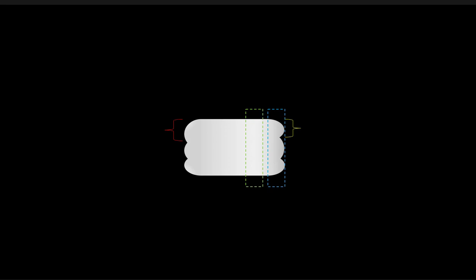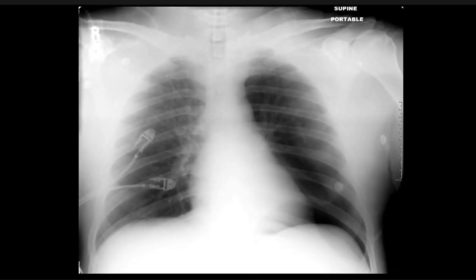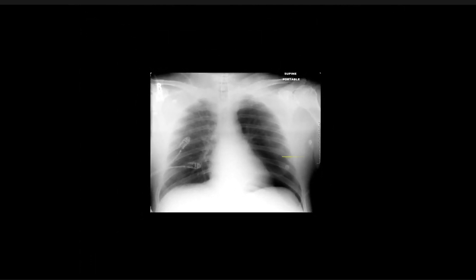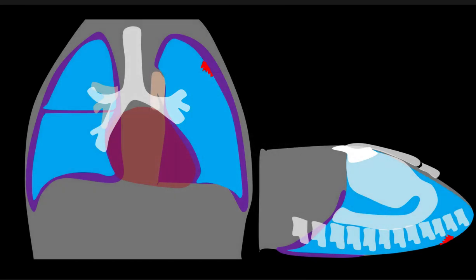And this is useful on a lot of different imaging modalities. So, here we go. We're trying to compare the right side to the left side, which one looks darker. We make it a little bit smaller, and I think that you can appreciate, hopefully, that the part there in the yellow box is darker looking than the part there in the red box. So already our suspicion is high.